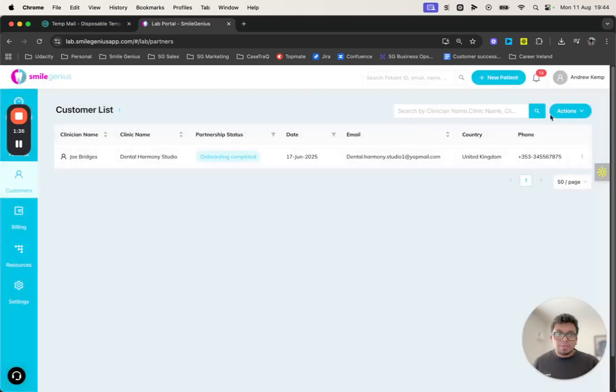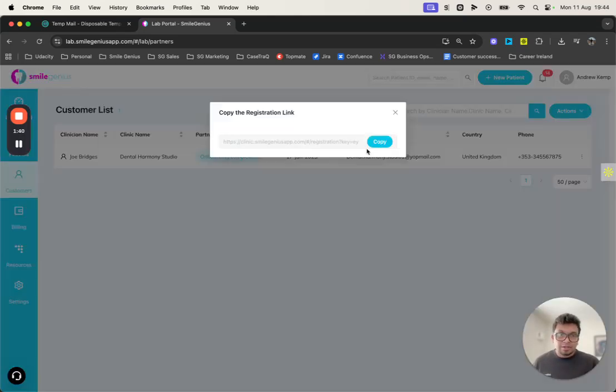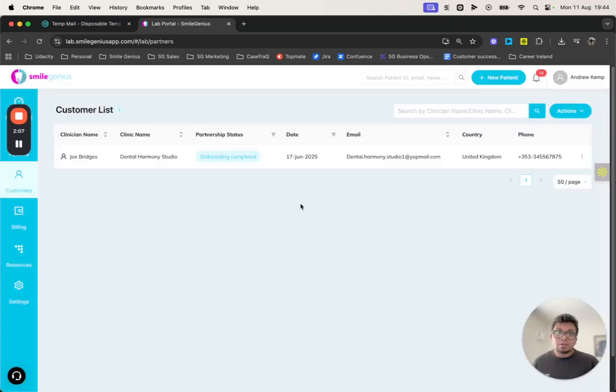And lastly, we've taken a slightly different route on how you can onboard your clinicians, especially if you are trying to be marketing driven. You could be sending out marketing emails to your leads, or you could be at an in-person event where you want the clinicians visiting your booth to be able to download or register onto the Smile Genius platform on the spot. This link, which can also be converted to a QR code, can be copied or shown to these clinicians, so you can onboard them on the spot or when you have their attention through email.